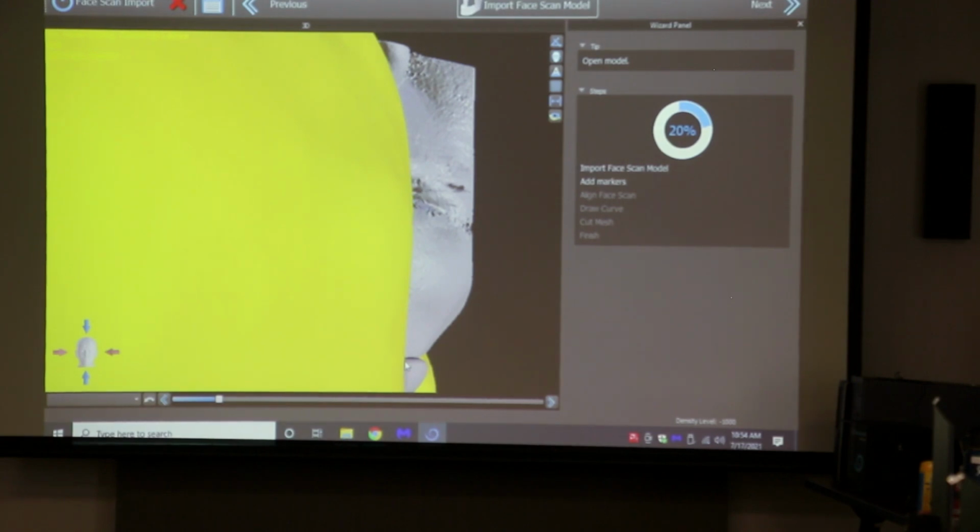Import STL model. So first you stitch the iTero scans. So first you do the STL models. I mean, you don't have to. You can do the face scan, it's not really dependent on order. Then you select both of them: click one of them without shift, then hold shift and click the lower one. Yep, and do OK.